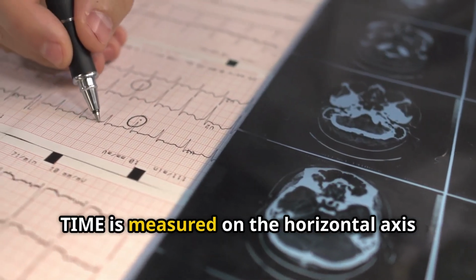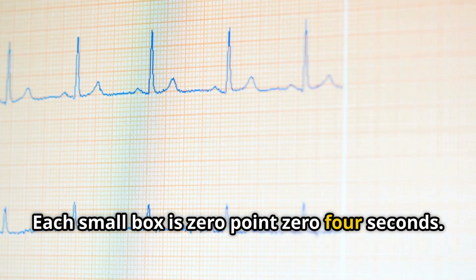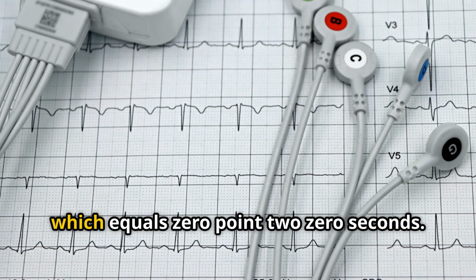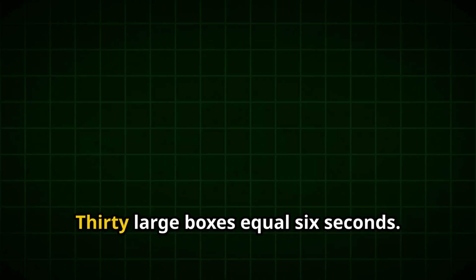Time is measured on the horizontal axis in seconds. Each small box is 0.04 seconds. One large box is 5 small boxes, which equals 0.20 seconds. 5 large boxes equal 1 second. 30 large boxes equal 6 seconds.